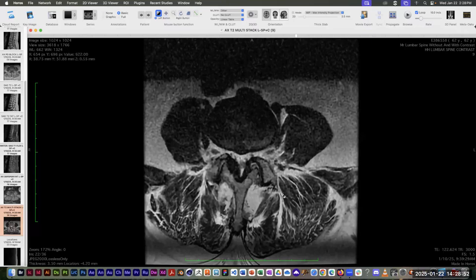The transverse processes are going to be more posterior, so closer to the bottom of the image. They're muscles, right? Can anybody think of a muscle that would be round in cross section that sits on either side of the lumbar vertebrae? You want to announce to everybody what it is? Psoas major. All right, those are the psoas major muscles sitting on both sides of the lumbar vertebrae.